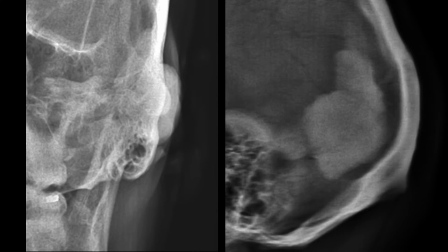And now that we're zoomed in, you should be able to readily identify this density on the frontal and lateral views. So radiographically, I would describe this as a slightly expansile, homogeneous, mass-like density overlying the temporal or occipital region of the skull on that right side. And there's no evidence of a periosteal reaction, no evidence of any adjacent soft tissue swelling or any aggressive radiographic findings.